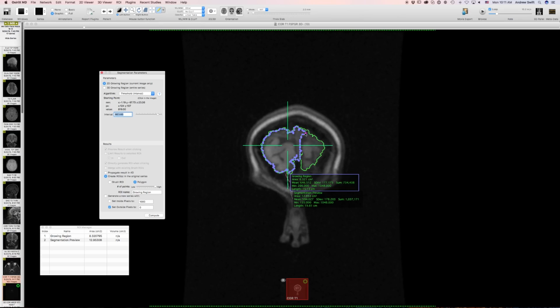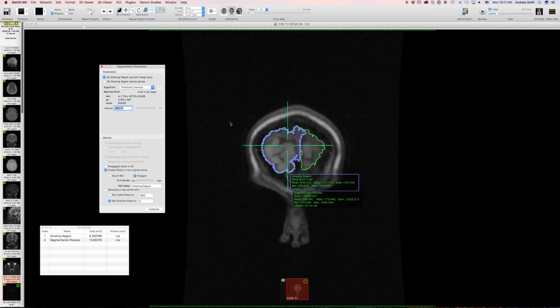So if I now hit delete, it's supposed to delete this first path, but instead what it did was it deleted the numbers in the interval box. It's really not ideal. So what you have to do is click outside of it. I'm going to click on the header up here and then hit delete, and it will delete the first one.